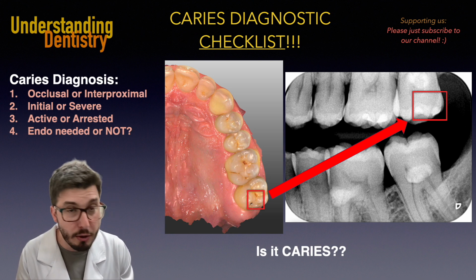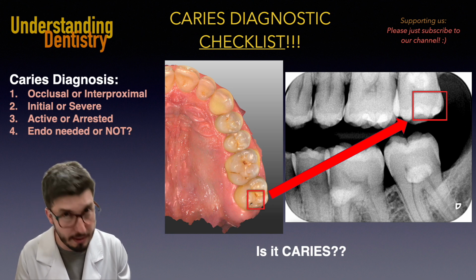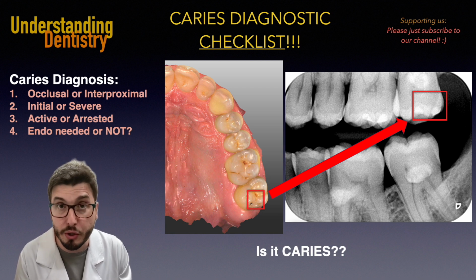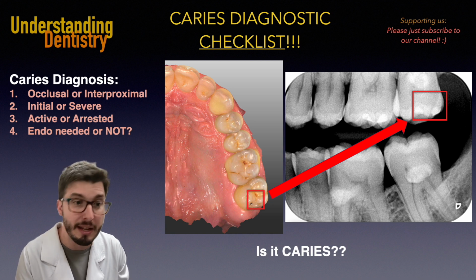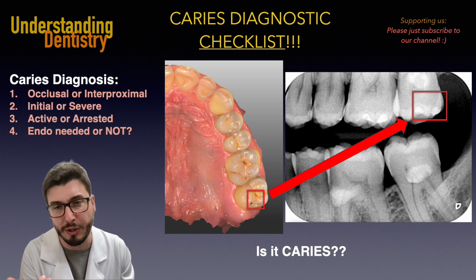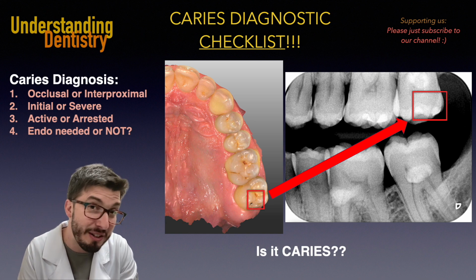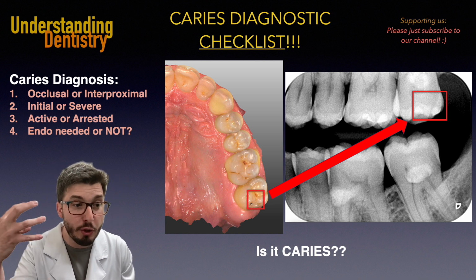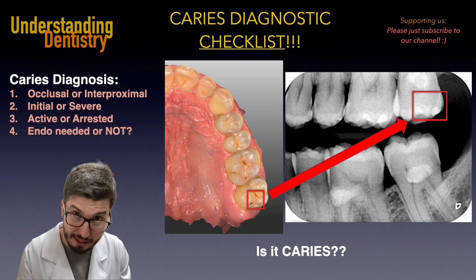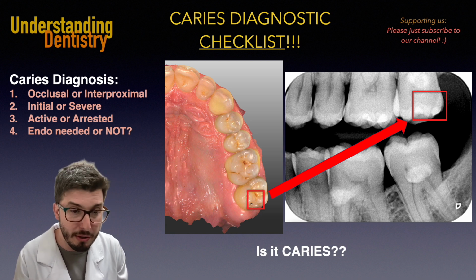Now, is this bite-wing correct? Is this a good bite-wing radiograph? So we don't say x-rays, we say radiographs. Well, not really, because we have a lot of superimpositions of the interproximal surfaces. The mesial of one tooth is superimposed to the distal of the adjacent tooth, and that's not ideal. Why is this happening? Because we are not completely parallel to the mesial and distal surfaces of the teeth, right? So make sure that you have the correct directions when you do your bite-wing radiographs.